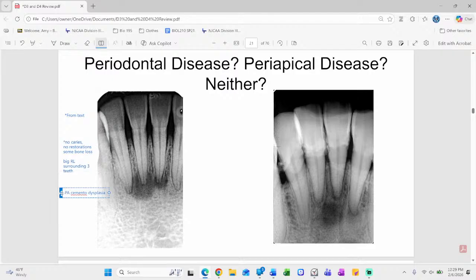And again, we haven't tested. I know of no other tests. We are looking radiographically. But remember, it is African American, middle-aged females, but it can be anybody. Outside the box a little bit sometimes, all right? Periapical cemental dysplasia. Same over here. That's what this is also. Periapical cemental dysplasia on both images.